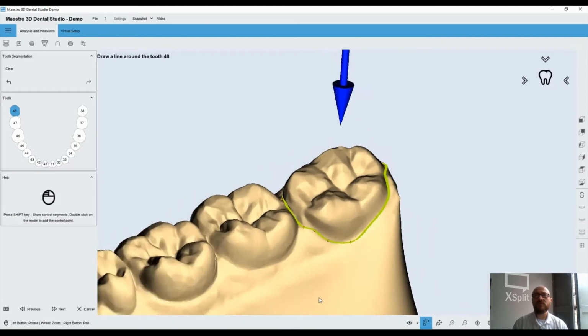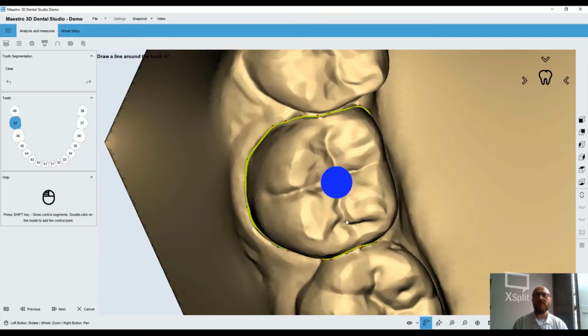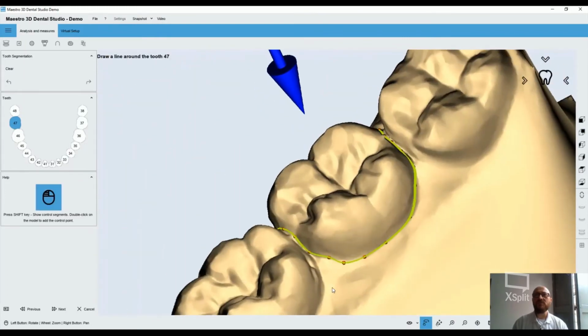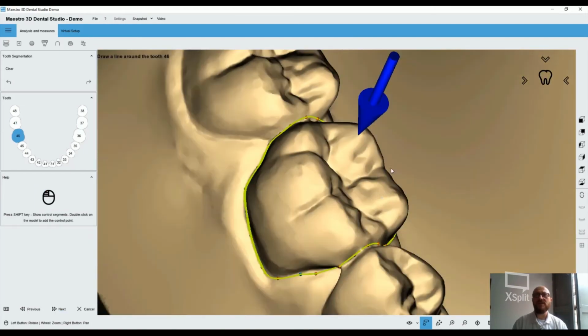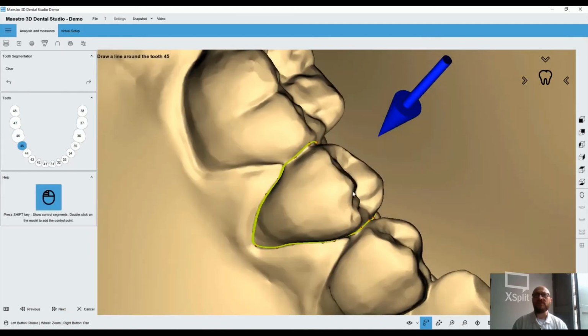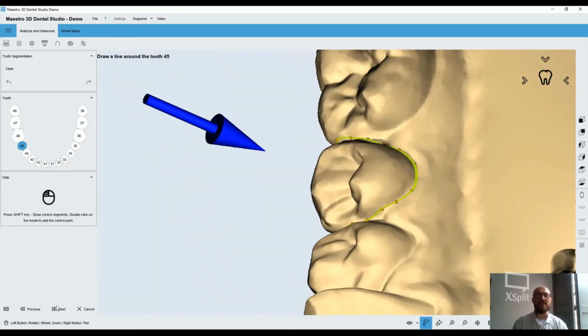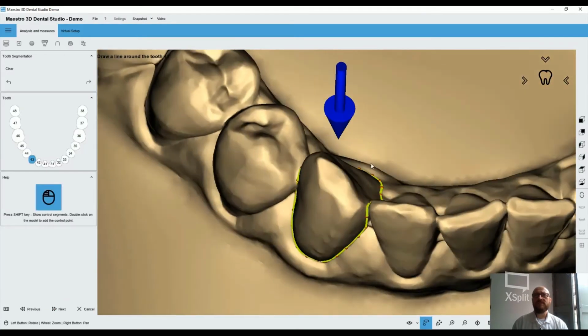Wow, pay attention when you move your mouse, don't do it so fast as I'm doing. The software is asking to me now to check if the detected trimming lines are okay or not, and I have the possibility to fix eventual mistakes in this way, by moving the control points or by adding new control points in this way.